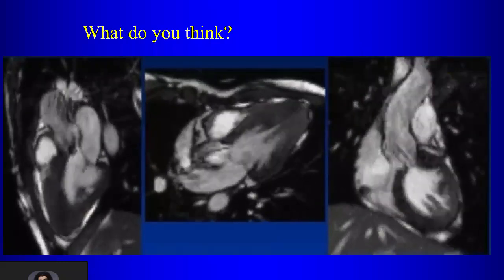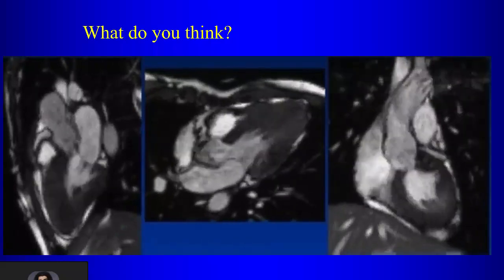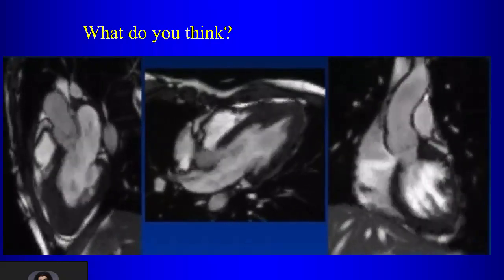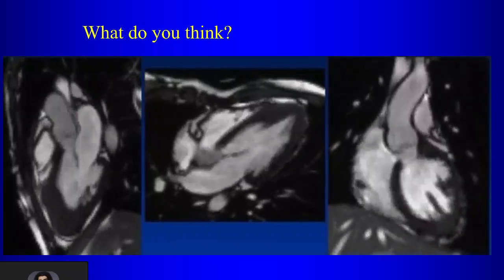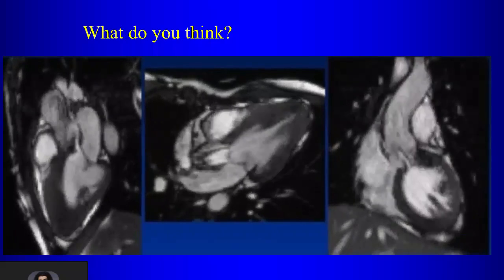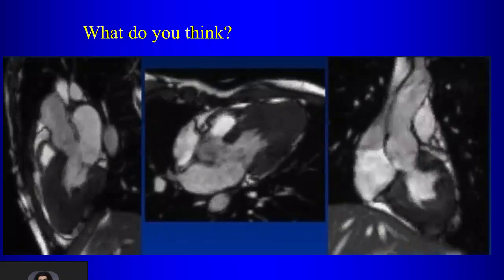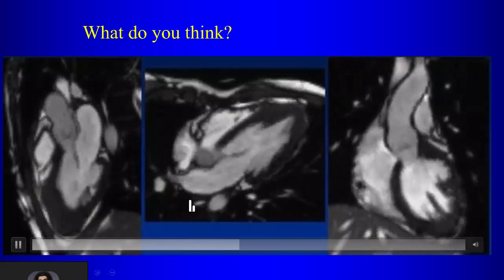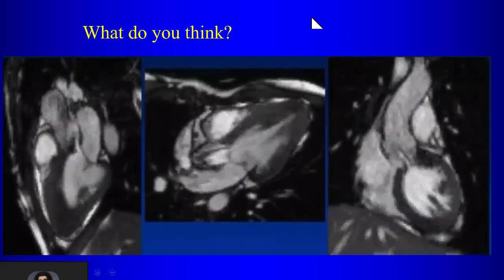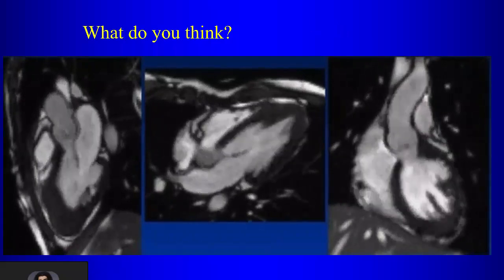So yeah, there's stenosis right below the aortic valve, but what could be causing it? So what's the most common cause of stenosis? Yeah, so hypertrophic obstructive cardiomyopathy. Is that what this patient has? How do you know? It's not hypertrophy. Yeah, it's not hypertrophy, right? I mean, you're looking at, here's the interventricular septum. It's not really thickened, so it's not the septum that's causing obstruction here below the aortic valve. So in that case, if it's not the septum, what could it be?